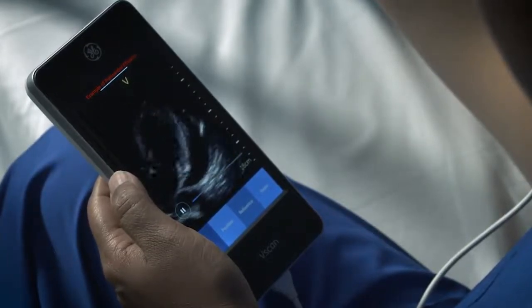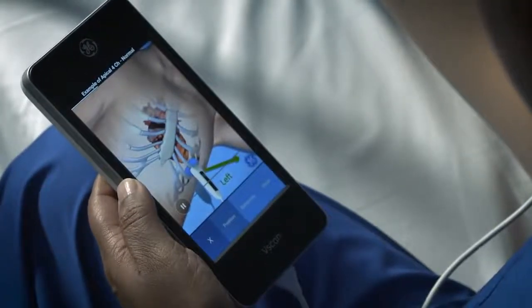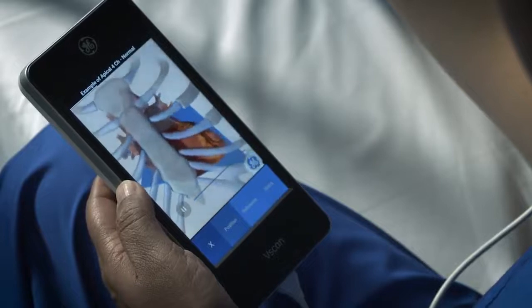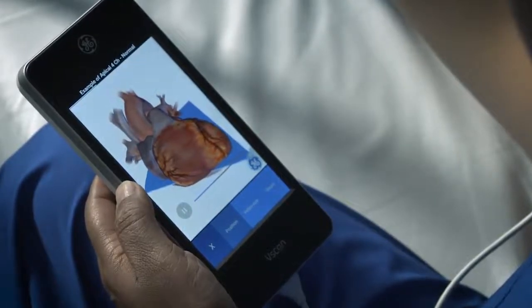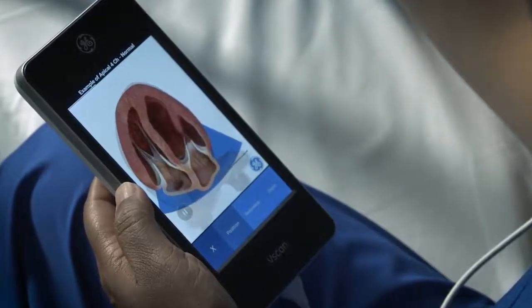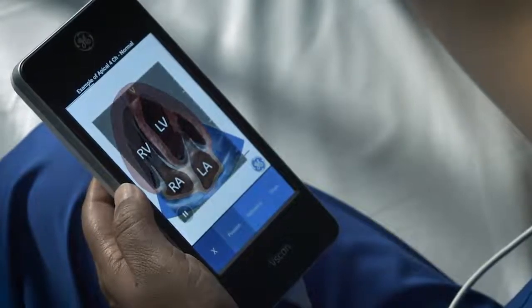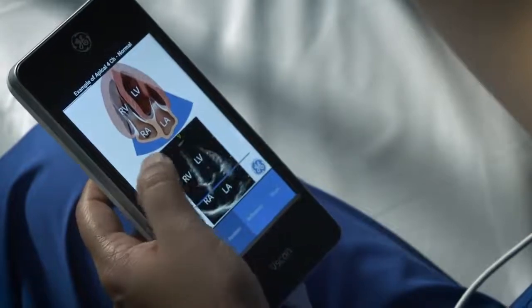If you have questions related to the position for the selected plane, simply tap the Position button. You will see a graphic animation to help you understand the relationship of position with the underlying anatomy. At the end of the animation, anatomical landmarks will be displayed for the selected view. There are animated pathology examples that can be accessed by swiping left.